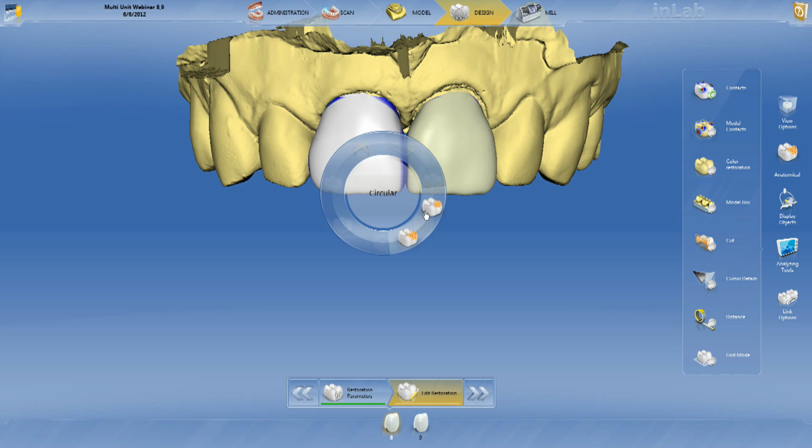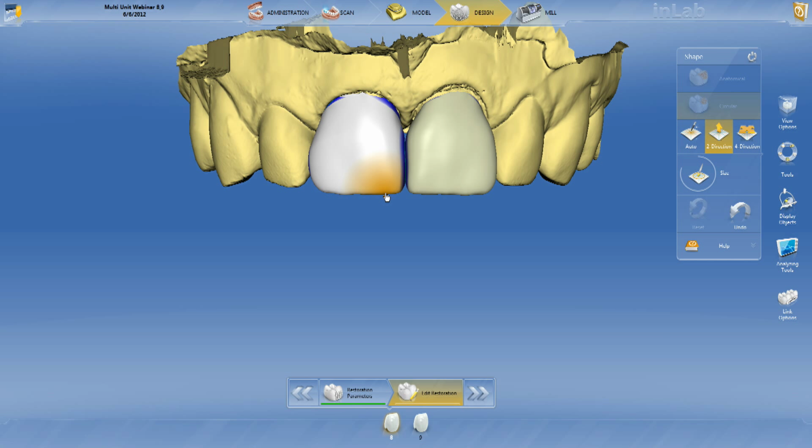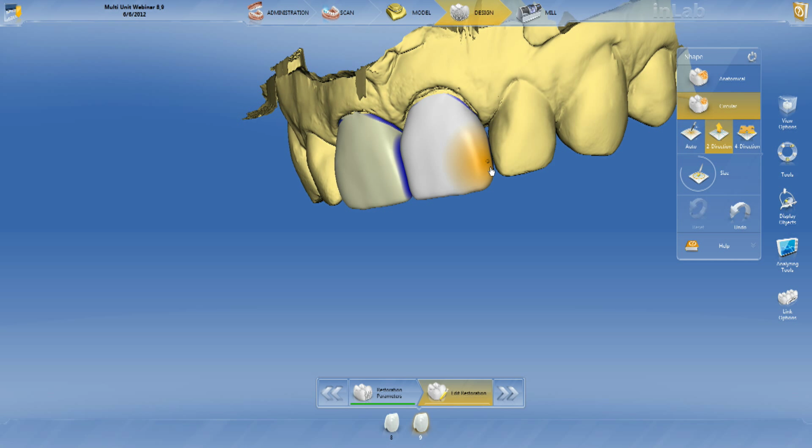So of course, you just want to fine tune it. Like I said, what's really cool is when you're on a tool, you can just go back and forth on what you want to do. Okay. Make it a little bit broader.